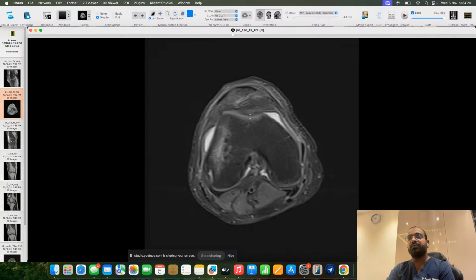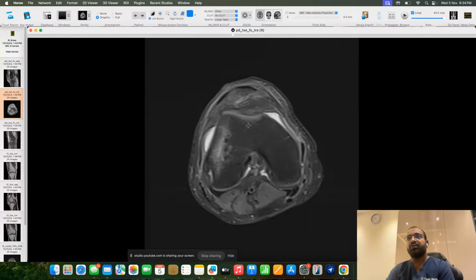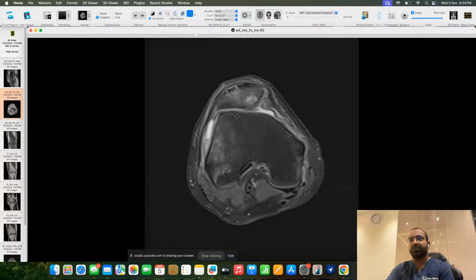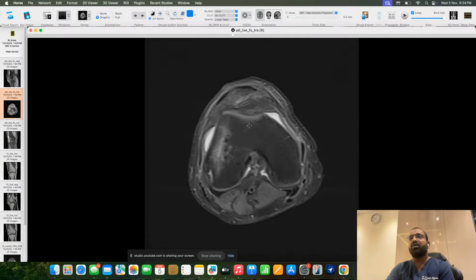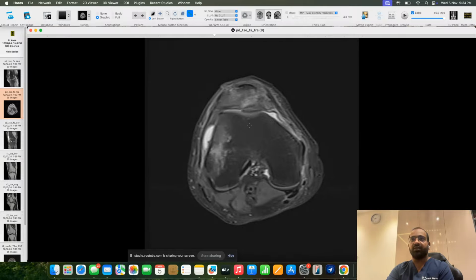This is the trochlear groove. Okay, where is that? Yeah, trochlear. So the trochlear groove is sitting here. Visually, if you ask me, there is a mild amount of trochlear dysplasia here. You see, it is almost not so concave. It is a little bit flat.